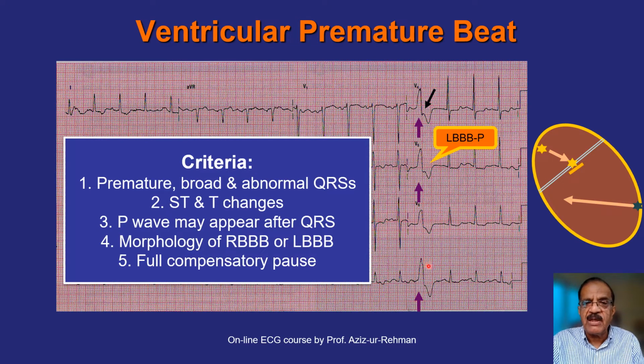So this is what I hope I was able to explain. I hope I have not made things more complicated. So there will be a full compensatory pause. Let's proceed further.